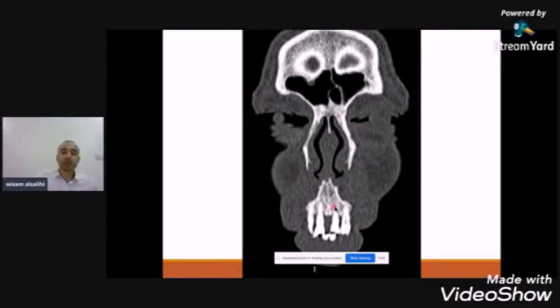Now the premaxilla starts to appear and the ascending process of the maxilla. The right and left ascending processes of the maxilla merge together in the center to form the nasofrontal beak. And this is the frontal sinus, and this is the cell. In the first reading of a CT scan, avoid mentioning any pathology; just see the normal anatomy first. This is the upper and the lower eyelid. This is the swell body, premaxilla.